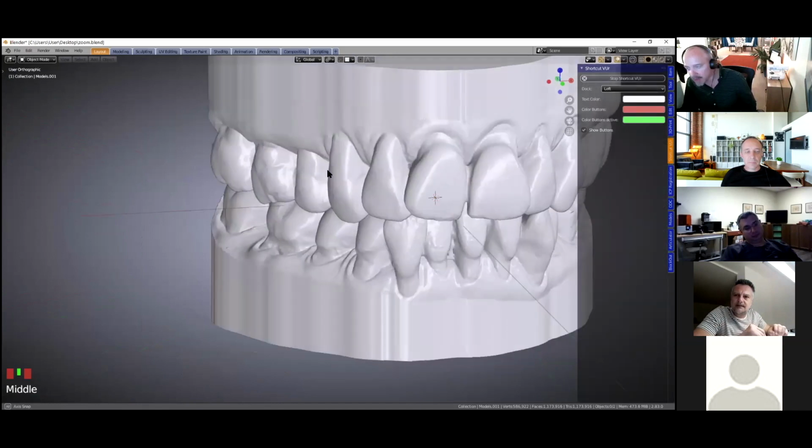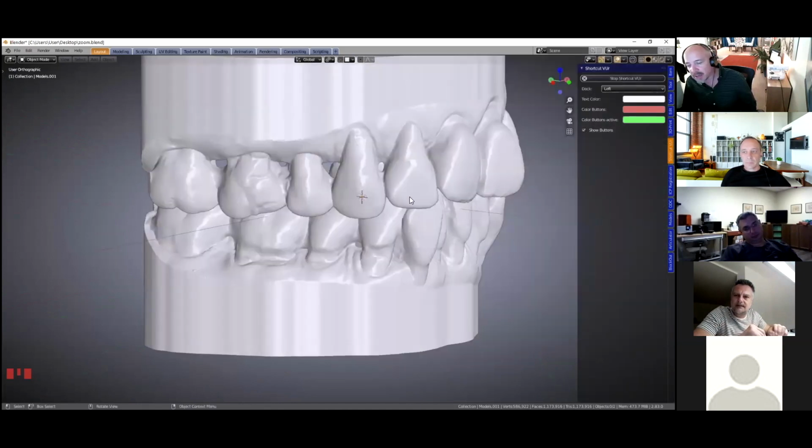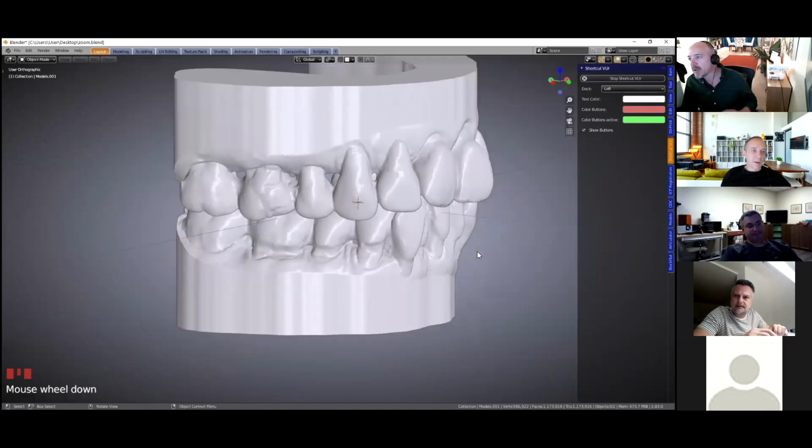So maybe we do a lower splint, or a dual, a top and a bottom, or a twin block appliance, something to shut the mouth.